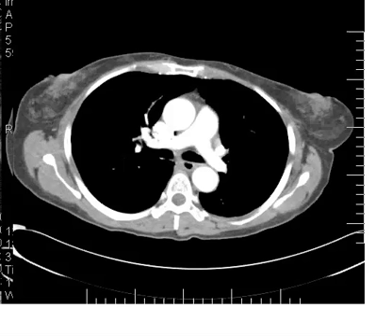I wanted to go through some of the anatomy that we see on CT chest, particularly for cases that involve rule-out pulmonary embolism, just to get people familiar with the anatomy so they can look through cases themselves and have a pretty good idea of what they're looking at.